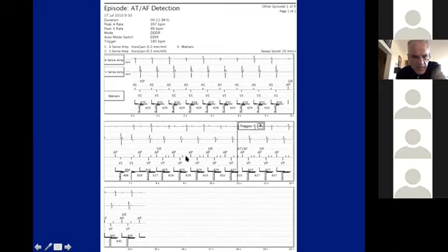So this one is obvious, right? This is retrograde conduction. So there is a big atrial spike. What is this marker corresponding to? It corresponds to this little blip there. What is that? Any takers? All right. It's a very rounded signal. So it's just almost at the same time that ventricular pacing occurs.